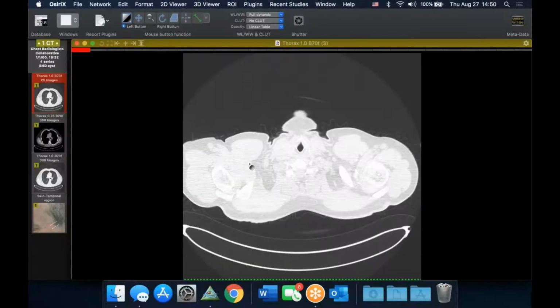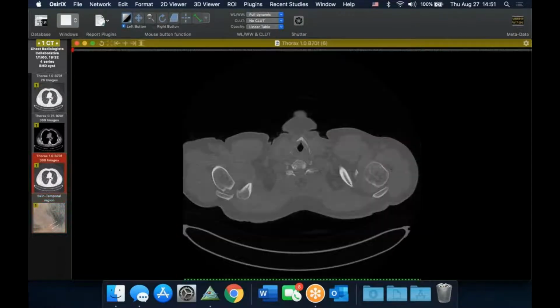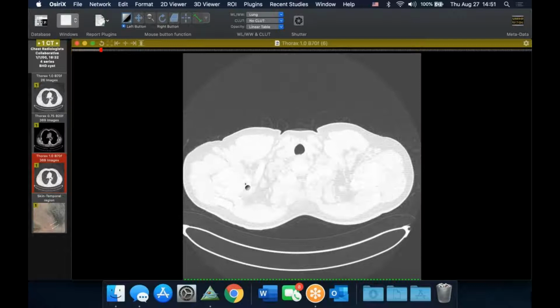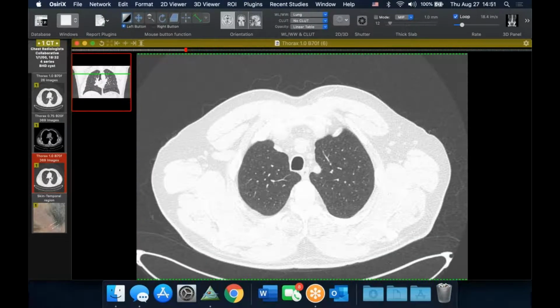This was a 55-year-old who also had these very subtle fibrofolliculomas. And he was saying he almost overlooked them, but knowing the patient had cystic lung disease, which I'll show in a second, you can look for them very carefully, because we've seen cases, and a lot of the ones published in people's lectures. I know we did a paper years ago on skin and lung, and the one we had had pretty profound skin findings, but they can be subtle. But I think most of us are fairly comfortable with the pattern of cystic lung disease associated with Birt-Hogg-Dubé.